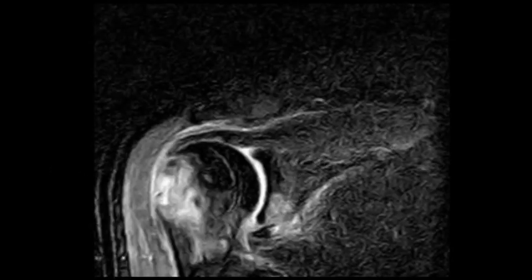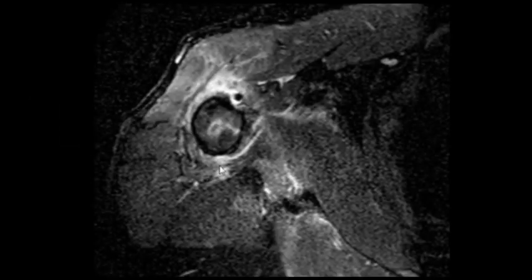However, the shoulder is relocated, but there is an obvious Hill-Sachs Bankart lesion. And usually it is due to which type of shoulder dislocation, anterior or posterior? Anterior shoulder joint dislocation, which is the most common type.